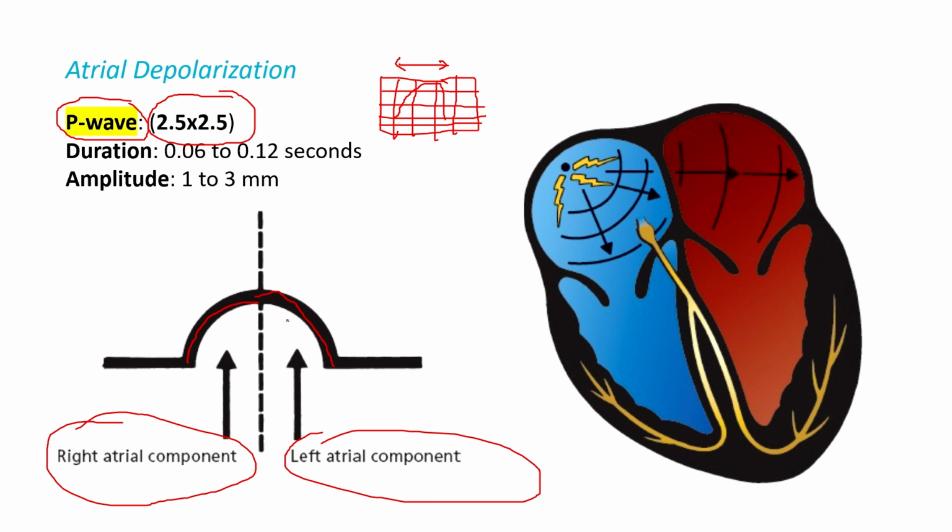If you have a left atrial hypertrophy, you're going to have a problem with the second part of the P wave. It will be something like that. For example, the first part is normal, but the second part, because there's a hypertrophy, there's more electrical impulses going there. That's why you can see another rise of the P wave. That's why we can see that's the left atrial hypertrophy.